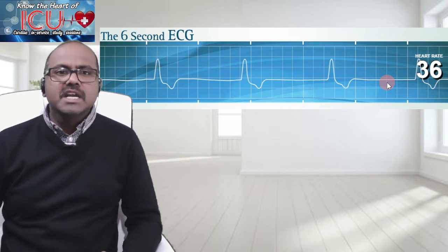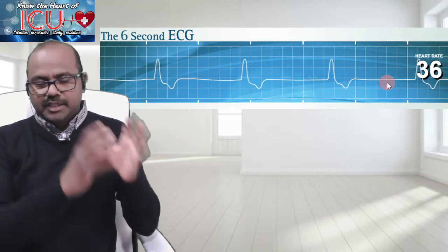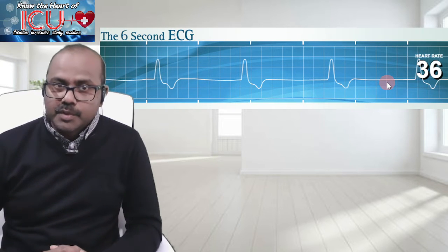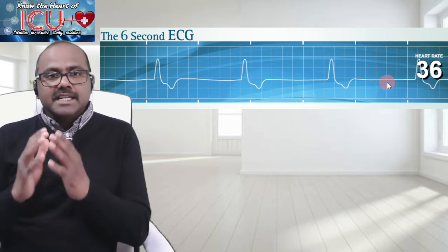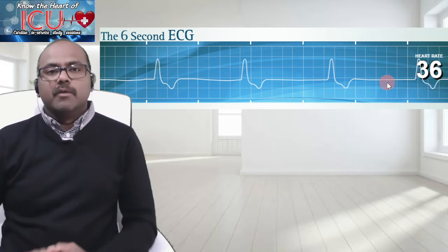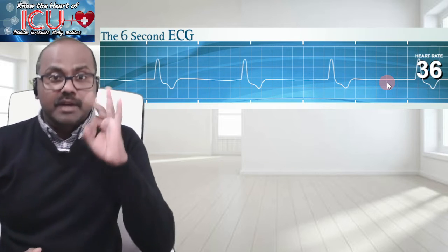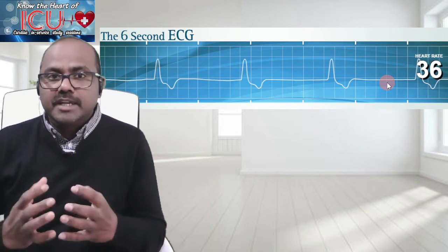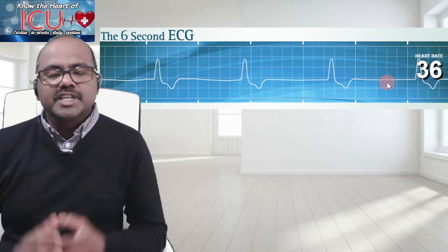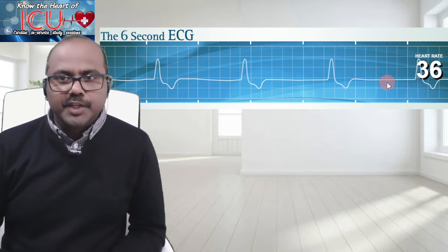That's a speciality of the myocardial cells of the heart. Every point in the heart, either the SA node or any part of the atria or the junction, that's the AV node, or ventricle, can produce an impulse. Whichever source has the higher rate will sustain. But in this case, the SA node is silent, your atria is silent, your AV node is silent, so the ventricle had to take over the role of an impulse generator or a pacemaker. The ventricle can produce the rate only in a slower manner. So it's a ventricular rhythm, and it's an idioventricular rhythm.